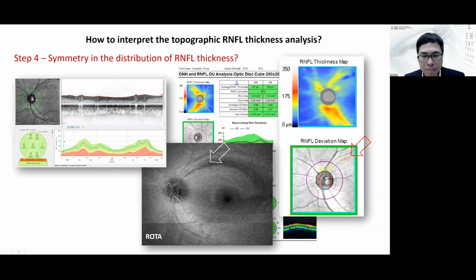Now, notice that we also have here a circumpapillary retinal nerve fiber thickness scan. As mentioned, if we're just looking at the quadrant measurement or even the T-SNITs measurement, we're not able to detect any abnormality. So the important take-home message for you all is we need to move away from the circumpapillary scan to topographic analysis. We need a wide-field assessment of the retinal nerve fiber layer, because when we are looking at very close to the optic disc, we tend to miss information.